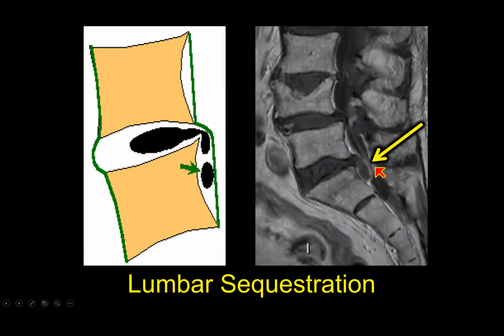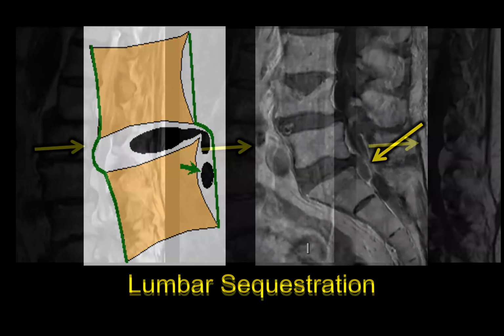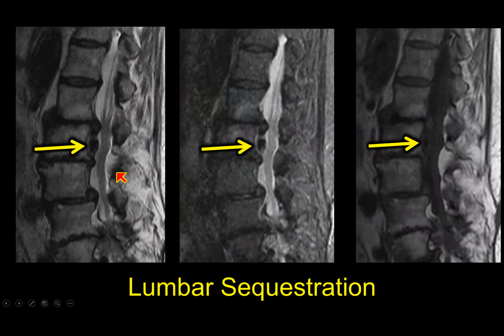If we get contrast, we may, similarly to the extrusion, see enhancement around it. And again, you see a little bit different signal intensity as well as enhancement around this soft tissue, but you can imagine how that may have been a prior extrusion with inferior migration at that level. And again, we can see those anywhere in the lumbar, thoracic, or cervical.